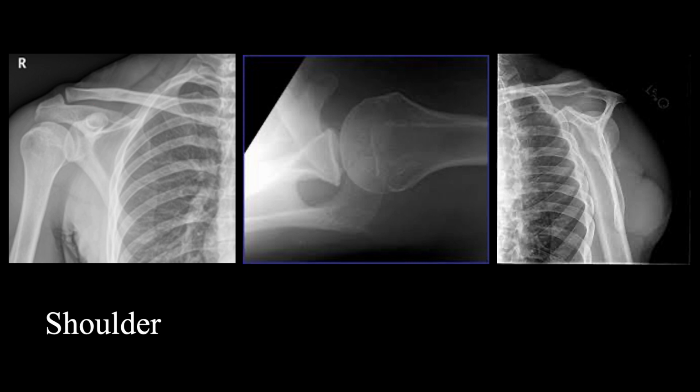So what I like to start off with first is I like to look that the inferior acromion and the clavicle are well aligned. So you want to make sure that this here and this here make a nice arch that lines up well. Then I like to look at the coracoclavicular distance. It should be about 1.3 centimeters. You don't want it to be larger than 1.3 centimeters. If that's split, then obviously the coracoclavicular ligaments are damaged, and that's something that you have to look at further.